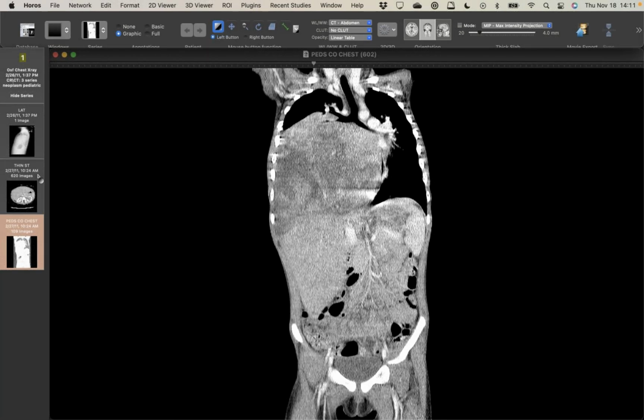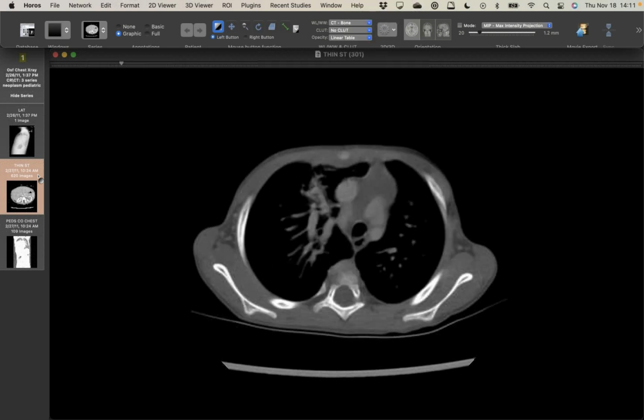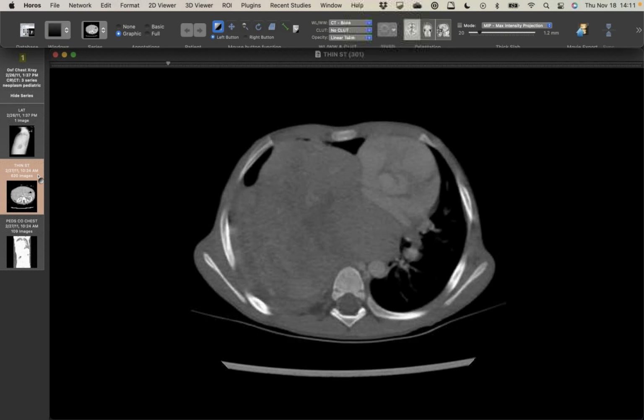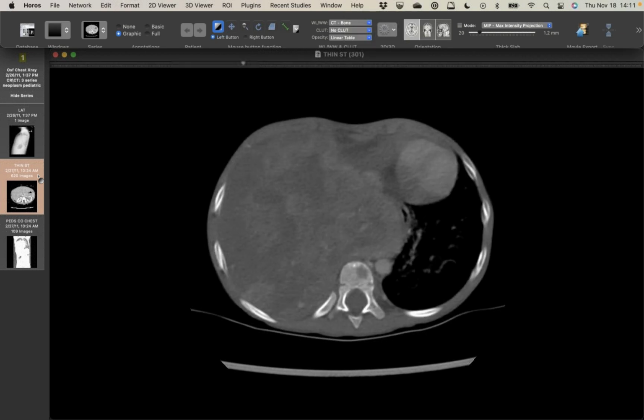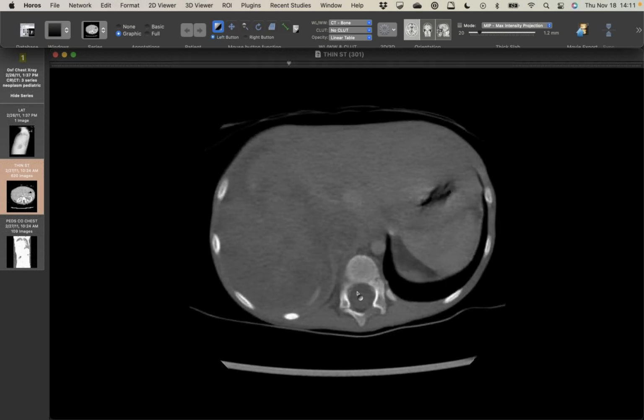And this one actually, if I remember, had bone mets, which I didn't realize these metastasized to bone. Where was that met? I think there was a vertebral body met. But yeah, there's some in the spine, for example. We see that one there. But when you see a really, really big chest mass in a young child, you think pleuropulmonary blastoma.